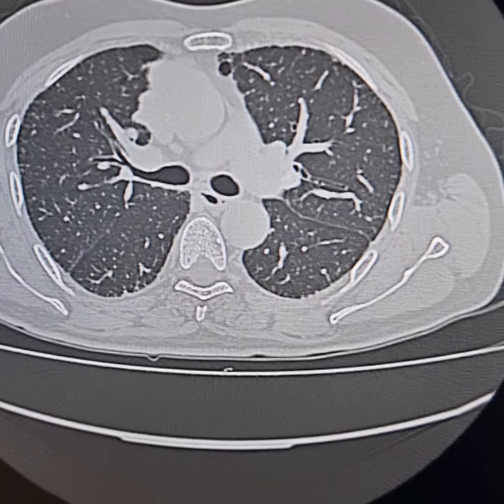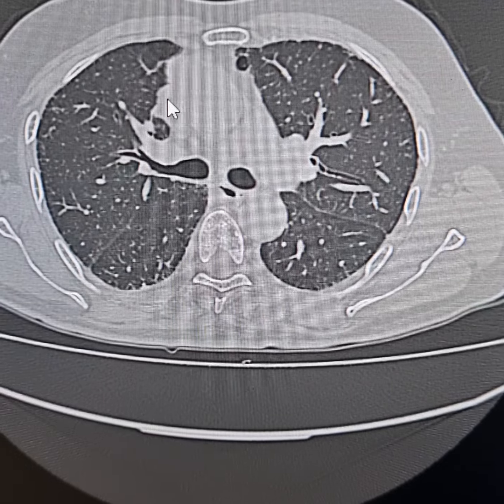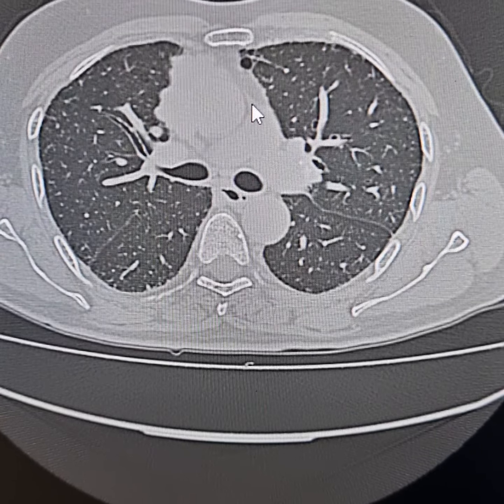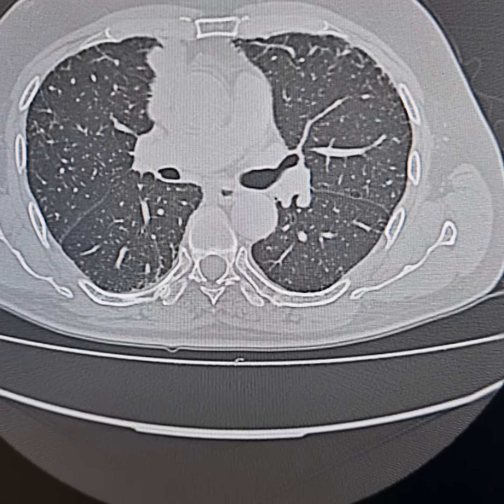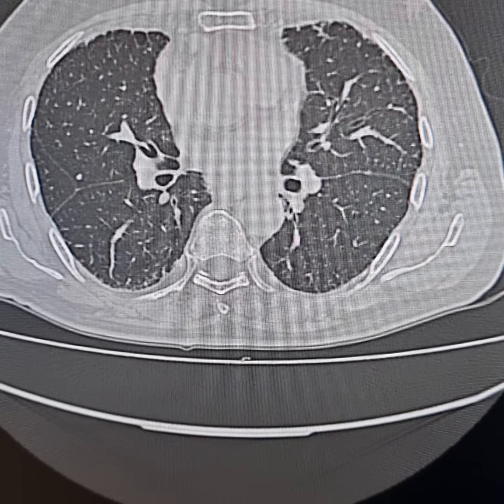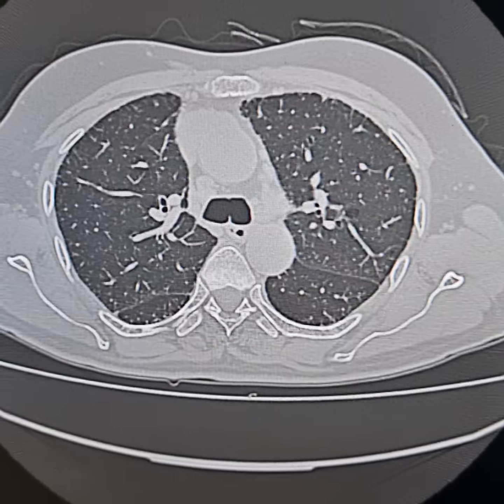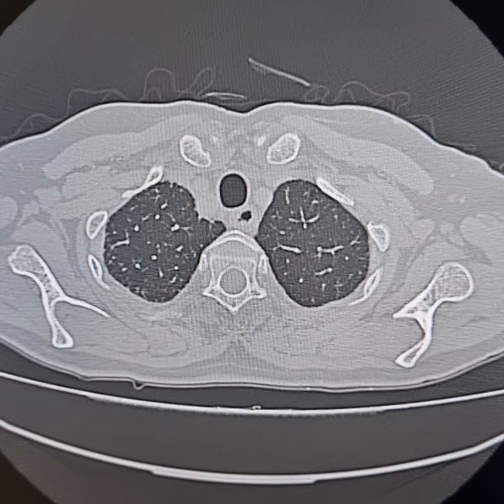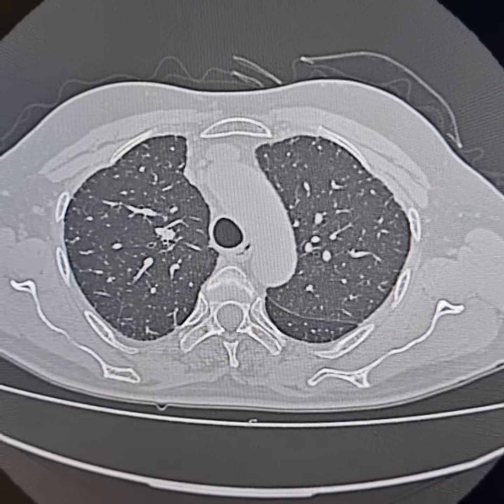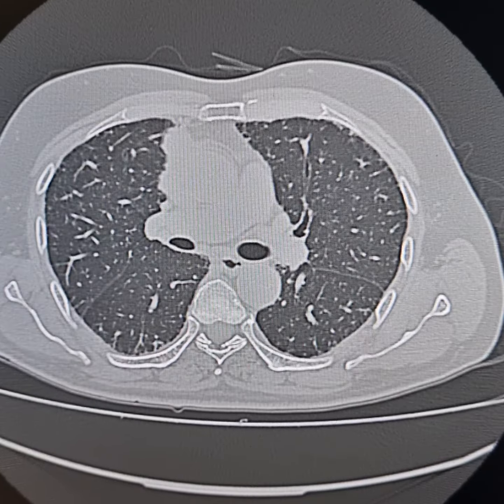Now please observe the nodular right lateral border, which is extending into the adjacent medial part of the anterior segment of right upper lobe. Now there is interlobular and intralobular septal thickenings. Although the findings are very subtle, they are suggestive of early interstitial lung disease.